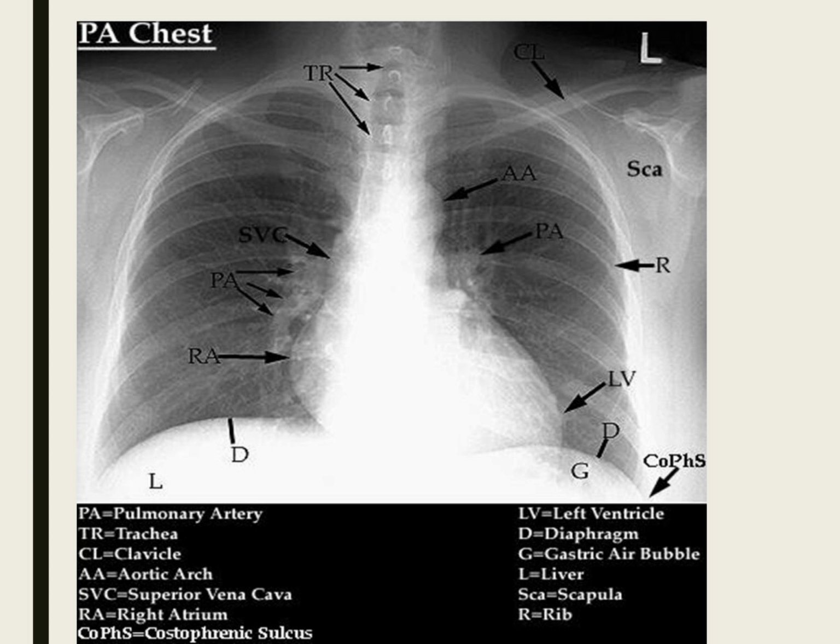E is everything else, which is what I care about, the pulmonary stuff. It's your lungs. You have a right upper, right middle, and right lower, overlapping. The same thing on the left: upper, lingula, and lower. Remember, these lobes are kind of triangle shaped from the side, so they overlap. So it's sometimes difficult.